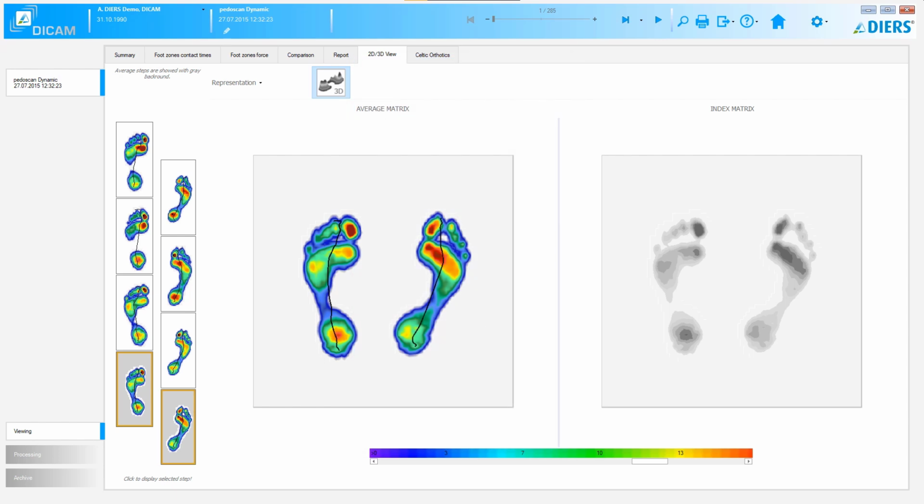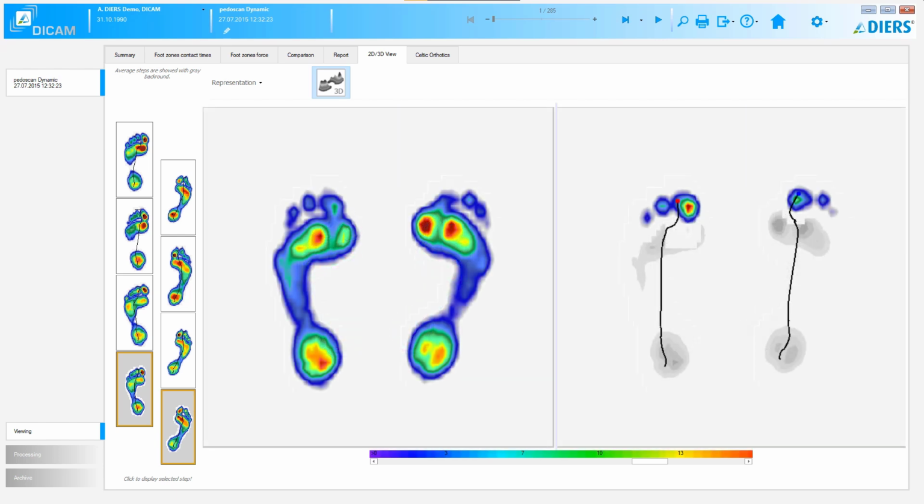Many foot dysfunctions that are not yet apparent in a static situation can be detected much more precisely via dynamic loading, since individual zones may be loaded more selectively over time. The last point mentioned as an example: if you can see toes in addition to the hallux at the last moment of pressure release, this can indicate relief of the hallux, for example in case of a hallux rigidus.